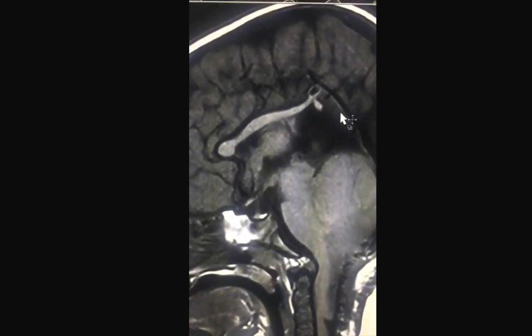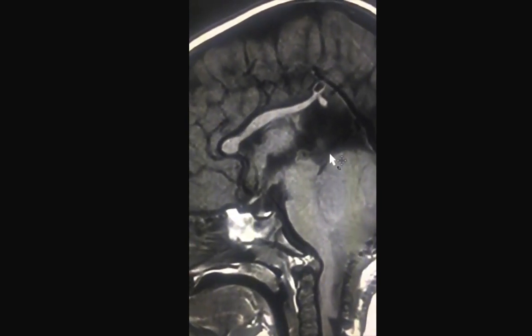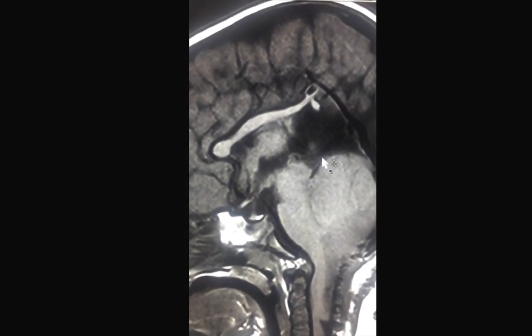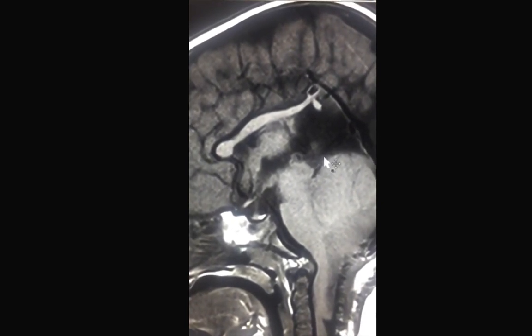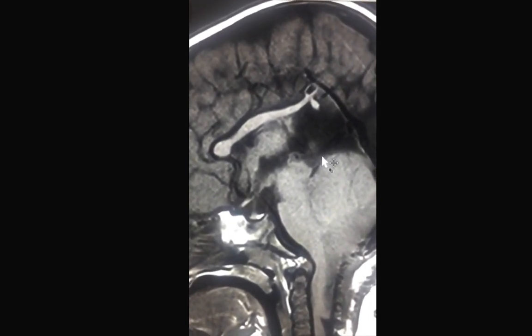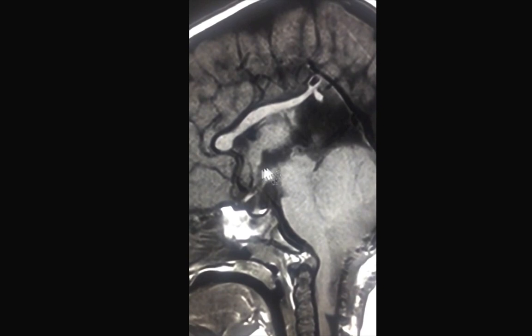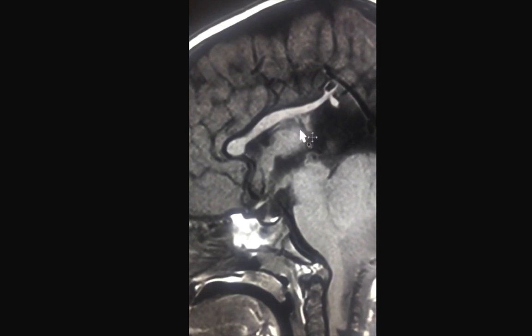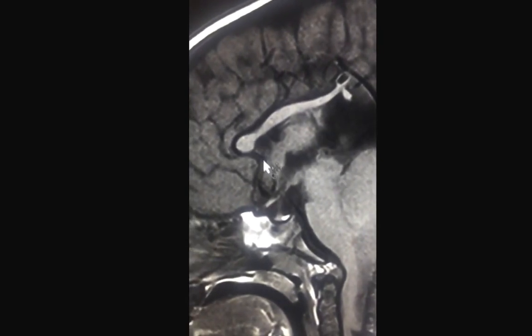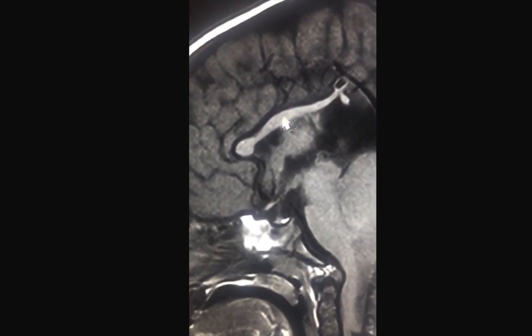So to summarize, this is a case of a Chiari malformation with partial agenesis of the corpus callosum. Our first teaching point is to understand that the corpus callosum connects both brains. Our second teaching point is to know that it is composed of the rostrum, genu, body, and splenium. Our third point is to understand that it develops from anterior to posterior except the rostrum, which develops last. Finally, the rostrum should be absent in cases where you have partial primary agenesis of the corpus callosum. In cases where you see a rostrum, the insult has occurred after full development of the corpus callosum.